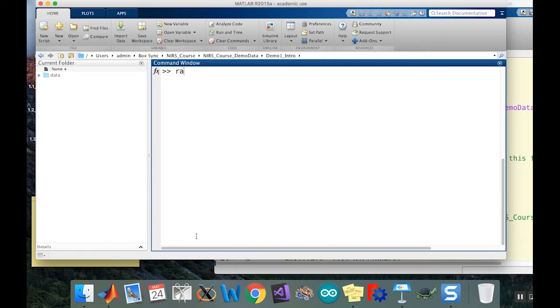Okay, so let's look at raw, and if we type the command methods, what methods does in Matlab is it'll give me a list of all the functions that can be invoked on that type of object. So if we say methods of a number, like 2, which is a double, we'll come up with a whole bunch of things like you can add it, you can subtract it, you can multiply it, etc. So it's a huge list of methods.